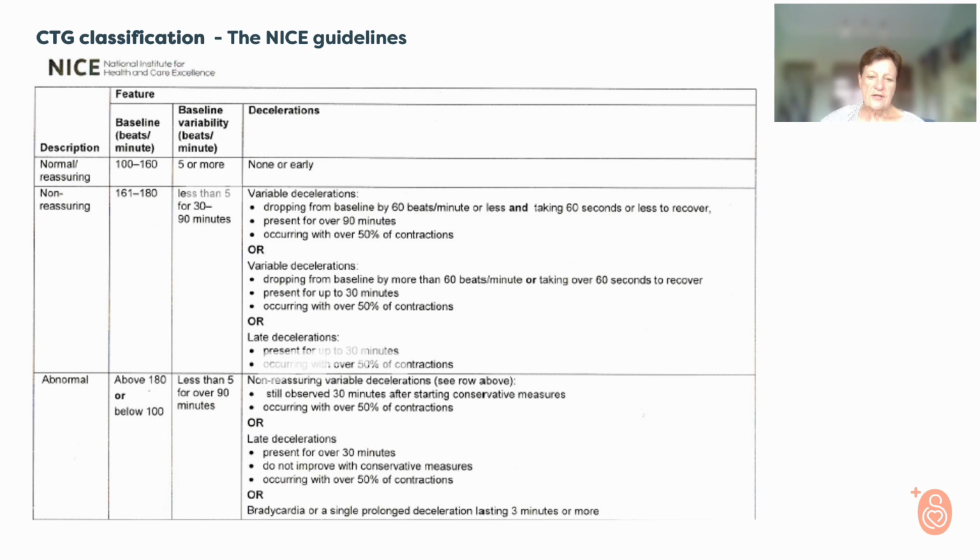And then also there were no decelerations. So according to the NICE guidelines, this CTG pattern would have almost been a normal one. Now we know from theory that increased variability is a definite sign of hypoxia or a possible hypoxia. So even though there's no increased variability on the NICE guidelines, I think that one should still treat it as if there is the possibility of hypoxia.